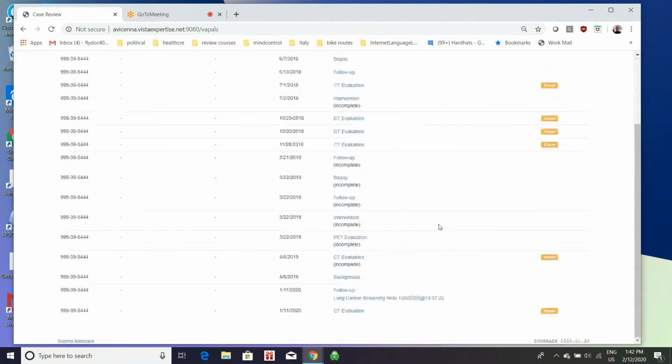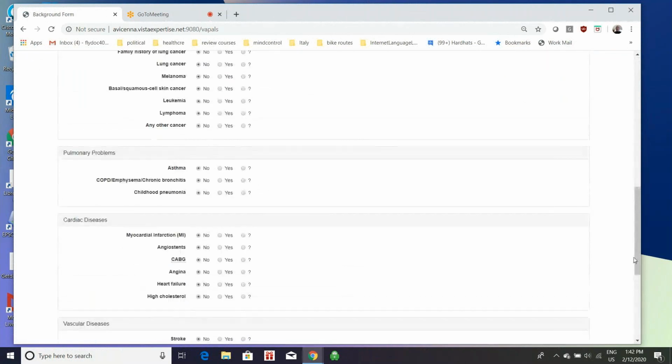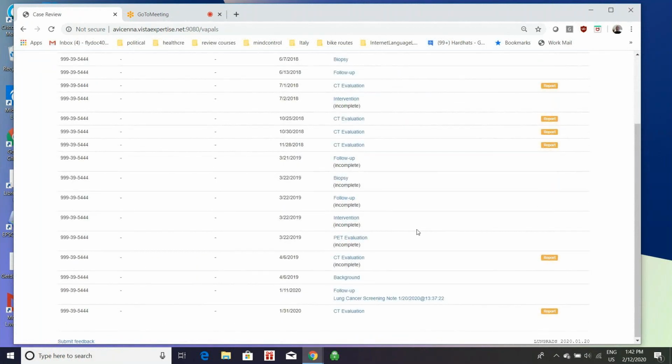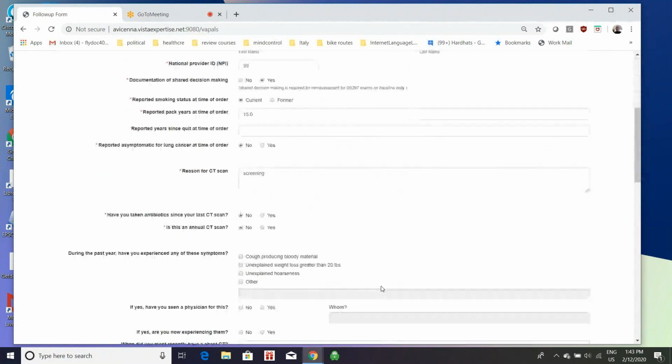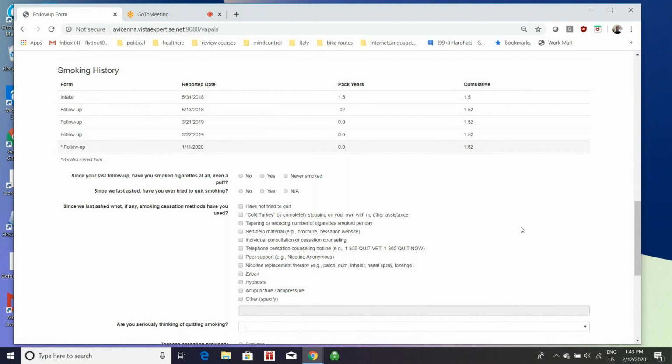And then the other thing, I think, if we look at this background here, no, that's not what I'm looking for. I'm looking for the table, a table to show that smoking history. Oh, okay, a follow-up. Just go to a follow-up. Here's a follow-up right here. Yep. Let me go to the form itself. Yeah, here's a table with a lot more follow-ups on it, as you can see. Sometimes if they're done very close together, there's not much added, and they quit smoking, but it will go and add accordingly.